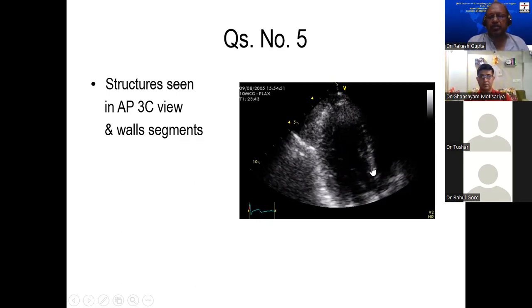What is the blood supply of this particular segment? LAD, first part before the diagonal. First diagonal, not before the diagonal, first diagonal. This is the second diagonal, right? Yes, sir. And the blood supply of these? That will be the LCX or RCA territory, depending on. Why LCX and RCA territory? Because dependent on what? The dominant artery. PDA is coming from the right side. Dominant artery, good.